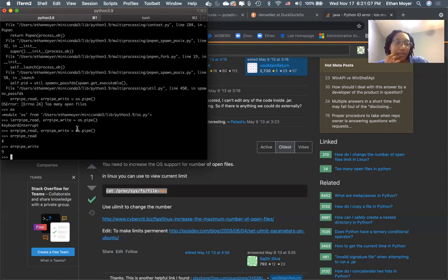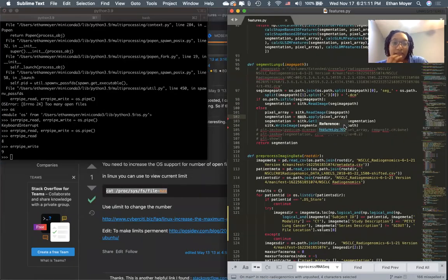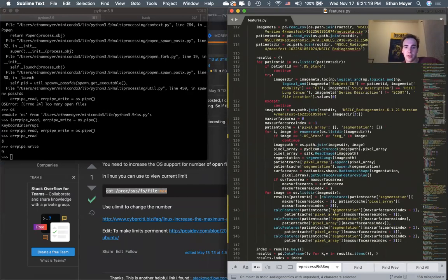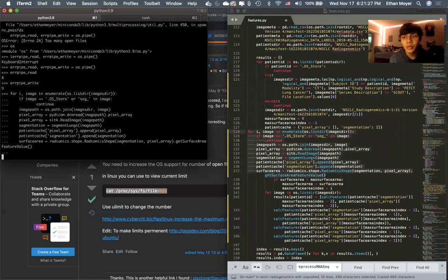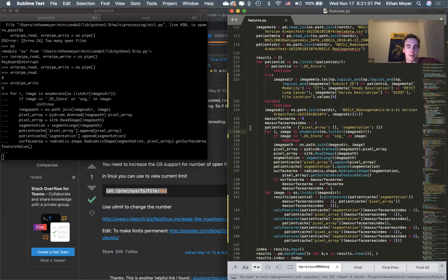How did you use the lung mask code before? How many files did you use? It stopped after about 200. Can we run on 200? I just want to see if the model is working or not. I can't run off of 200 because this is for one patient.